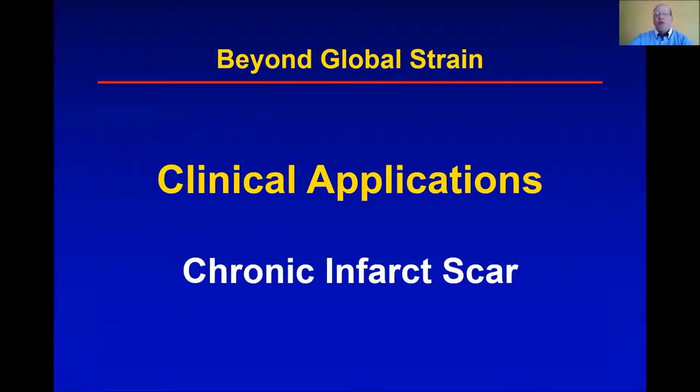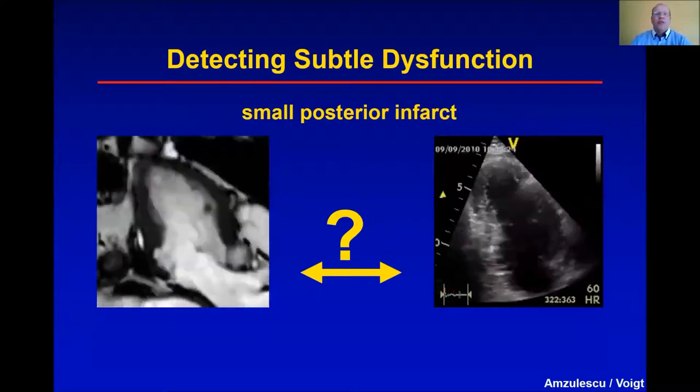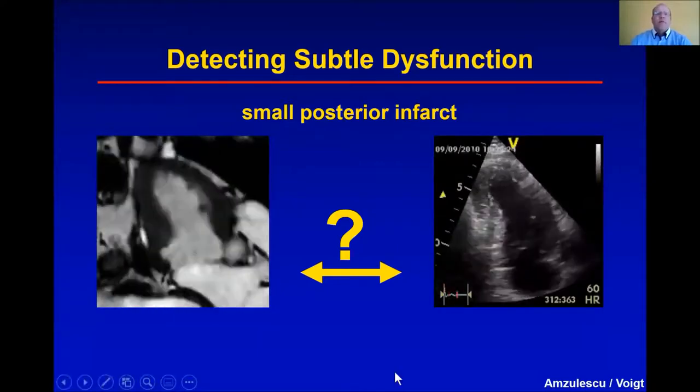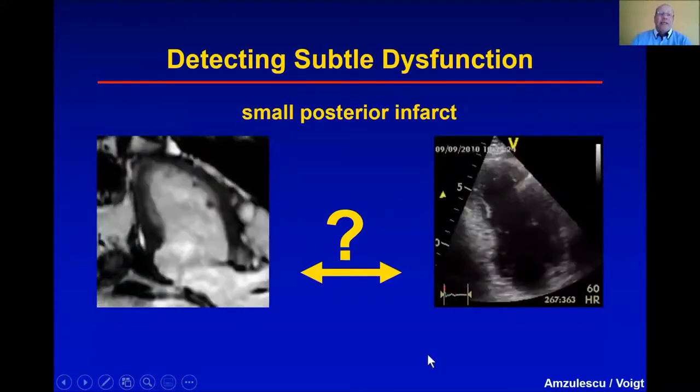Chronic infarct scar is also something you can identify, and I would like to show you this little example here from a patient of whom we knew that he had a little inferior infarct.